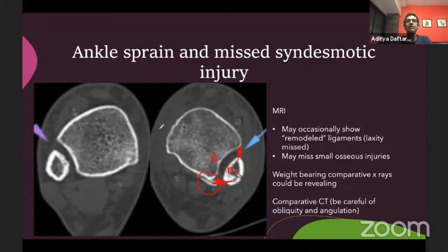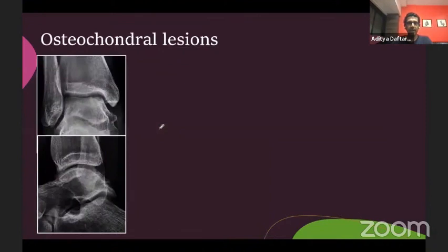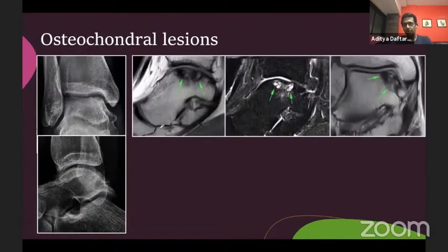When you look at the CT, when you see an injury pattern, you know the fractures, make sure you know what injuries could be missed, to look for those subtle widenings and subtle fractures that could say that you missed a particular injury. The second thing that happens in people who get ankle sprains, especially, and in other injuries, is they get talar osteochondral lesions.